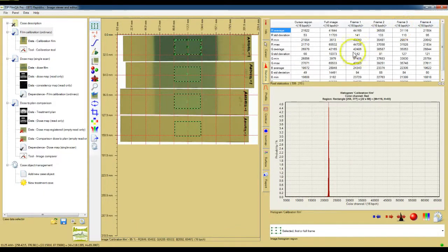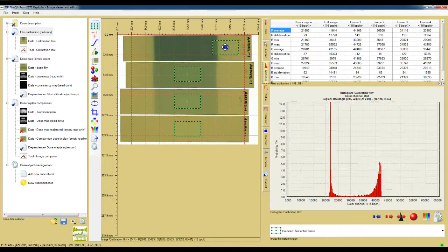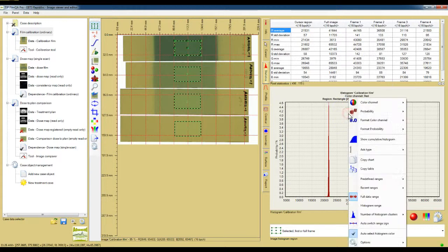The Statistics tab displays response or dose value information for the image. Values are given in tabular and histogram form, for the entire image area, the region around the cursor, as well as all regions of interest defined on the image. The display is live, as you will see if you take an ROI and drag it around the image. Right-click the table or the histogram chart to copy either to another application.